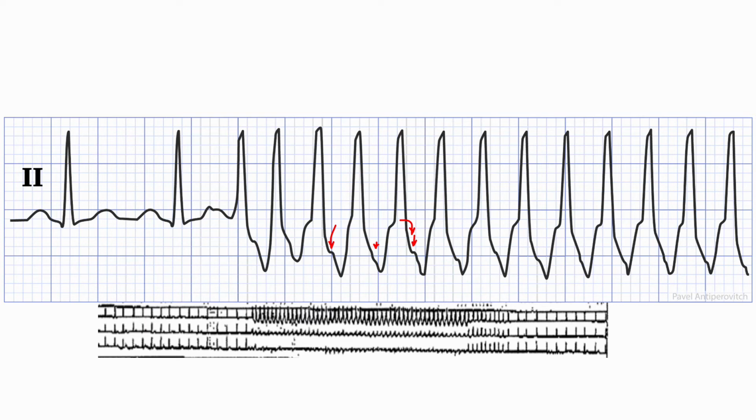And if this was SVT, for example, some sort of atrial tachycardia, this P wave would conduct to the next QRS. So if you see a 1-to-1 AV relationship, it's generally not that helpful because it could be VT or SVT with aberrancy. Now there is a bit of wobble here, and we could measure out to see if A's lead V's or V's lead A's to see what's the dominant rhythm here.